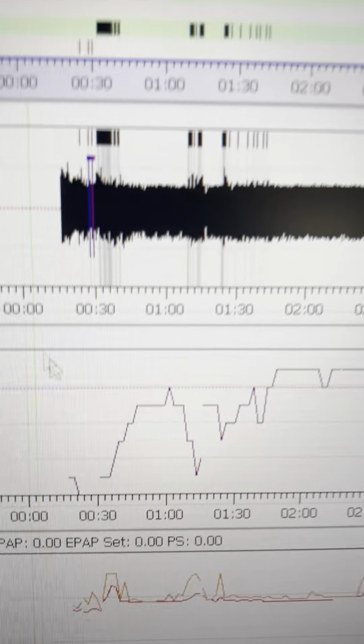Let's up the cc again on the same pressure. Now it's just 2 tubings. And here you can see it's a lot better. All of the under ventilation basically just disappeared right here. And now we can see a clear image of what's happening.